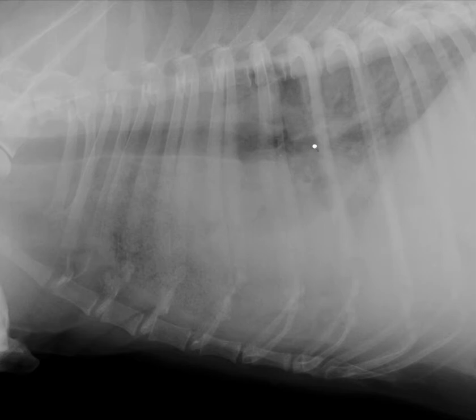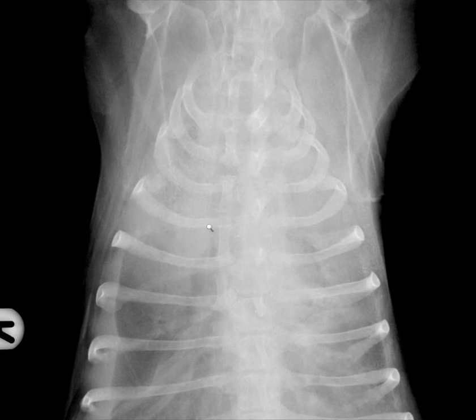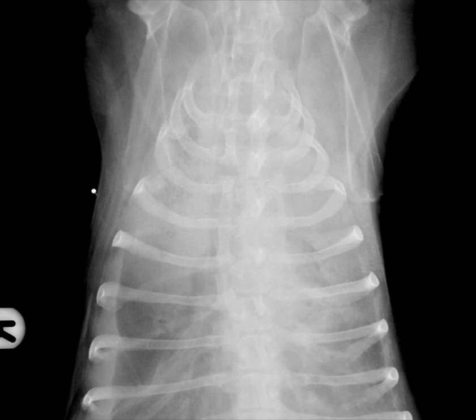So, although I wouldn't want to fully exclude, especially in a 14-year-old dog, that the lung lobe torsion could be secondary to some pre-existing underlying lung pathology, I think it's possible that this additional pulmonary opacity that we're seeing is just incidental hypoinflation or atelectasis. The literature would support that it's less common. Lung lobe torsion is usually not associated with pre-existing lung disease, but it certainly can be. So here's another example where we can see the lesion. We use our radiographic findings and especially knowledge of this special vesicular lung pattern and the distribution of it being in one lung lobe to kind of help us get to a fairly specific diagnosis.